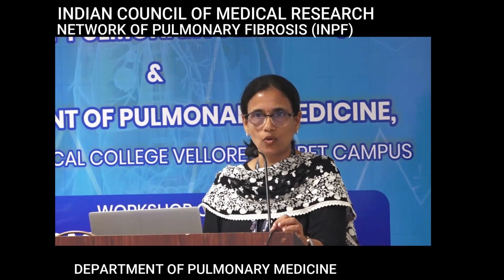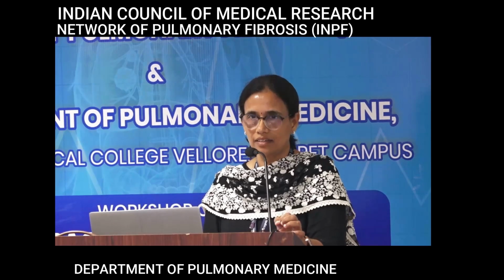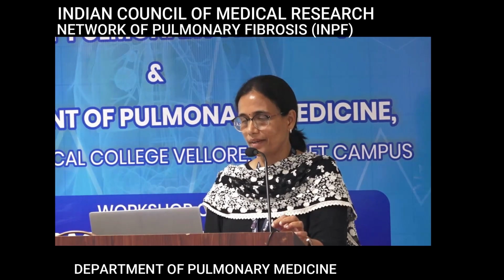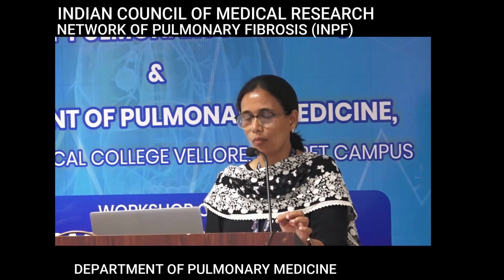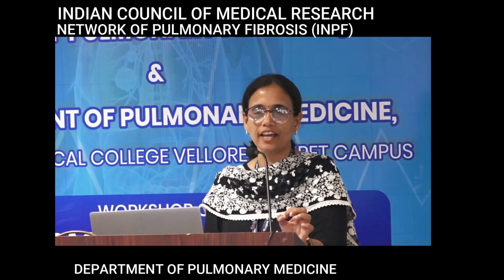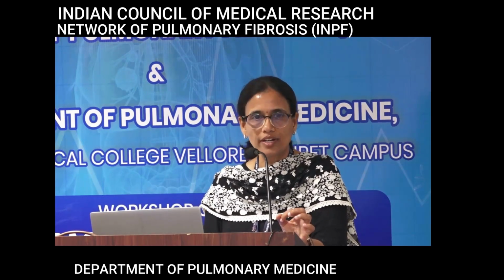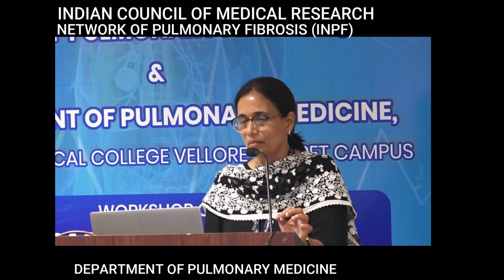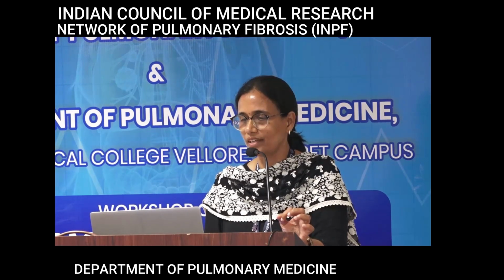There is honeycombing, right? And is there an apicobasal gradient? Yes. So what is the pattern here? UIP, probable UIP, indeterminate, alternate diagnosis. At first look, it looks like UIP, right? But let me just draw your attention to these things. What are these?